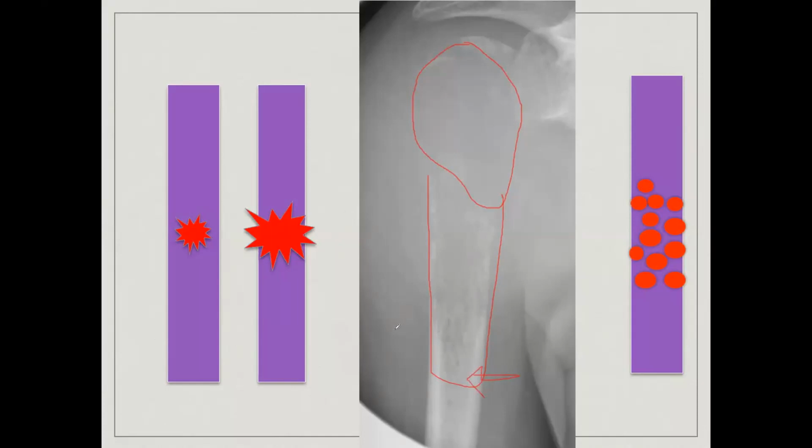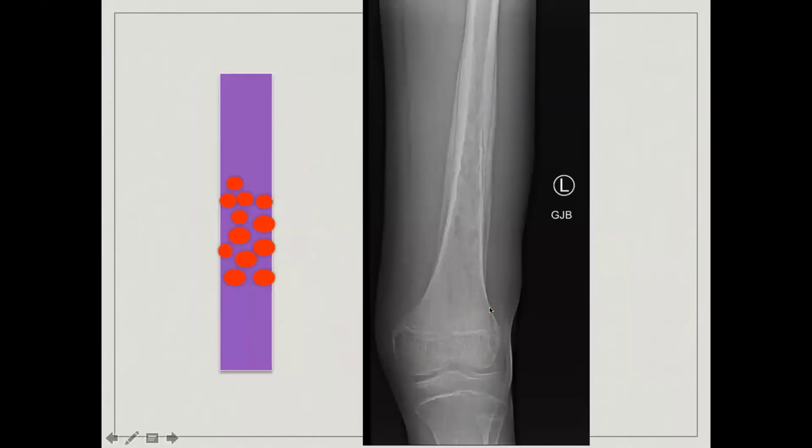So this is kind of a moth-eaten appearance, which we are seeing along the shaft of the lesion, which suggests an aggressive etiology. Also, this lesion is bursting out, there is cortical erosion, which again supports that this is an aggressive lesion with a wide zone of transition, right? You cannot draw a line over here. So this is very, very important, and this would really help you taper down your differentials later on, or at least decide between aggressive and non-aggressive.